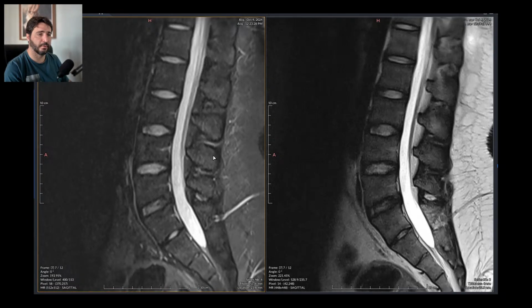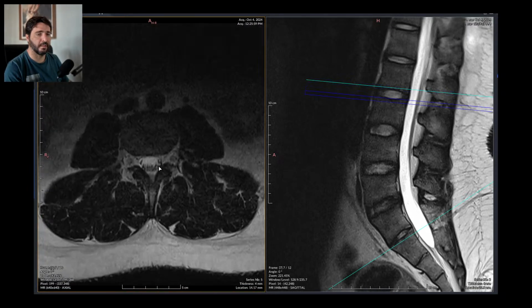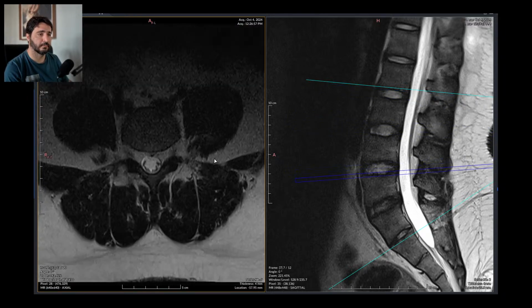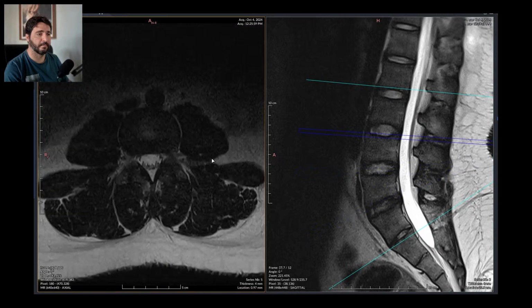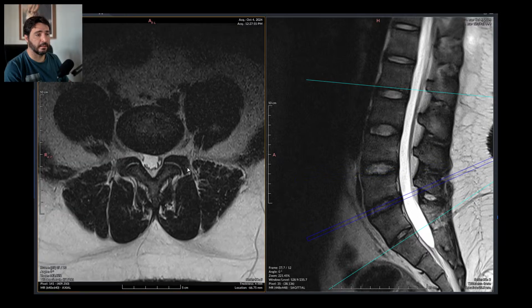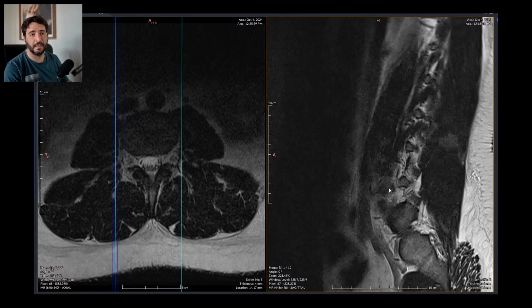I sure hope these exams could be reported by themselves, but they don't. So they pay me to do this. And of course, the technician decided he would only scan 4 of the 5 discs, because why not? No. Let's save some time and make an even worse exam. Yes, this is terrible. And people are paying for these scans.